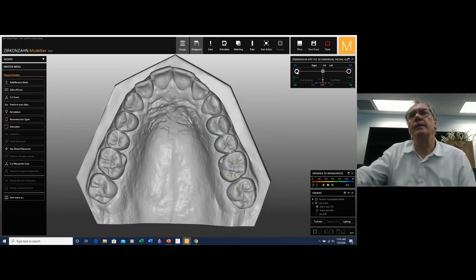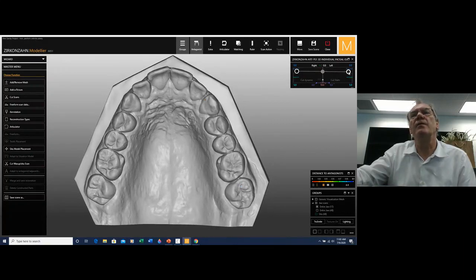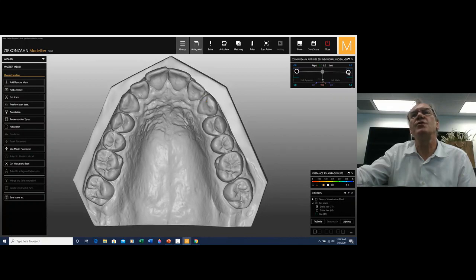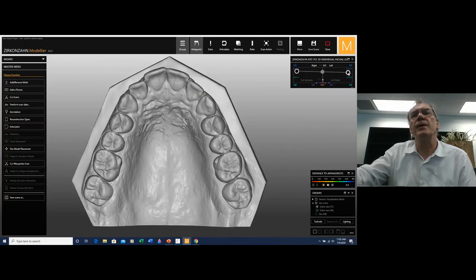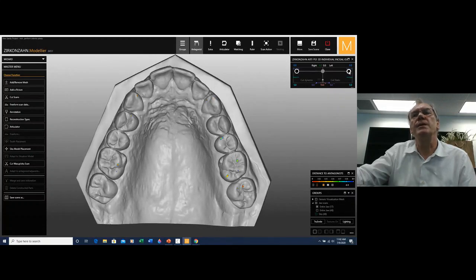There you are. So we have evaluated that. Let's go on the other side. At the first millimeter of movement, a contact appears on this tooth. This did not happen with the standard data. We carry on, second millimeter. Canine takes the load, third, fourth, and off we go. So there's a very, very small pre-contact on the working side in relation to the second molar.